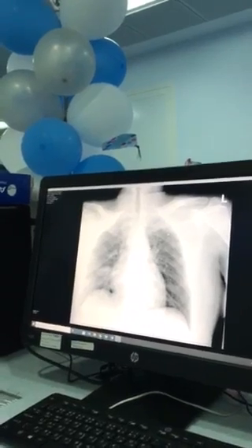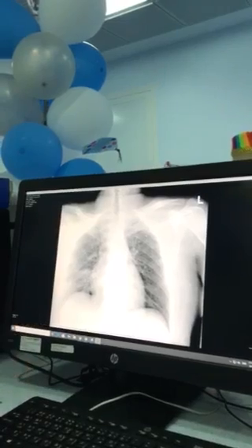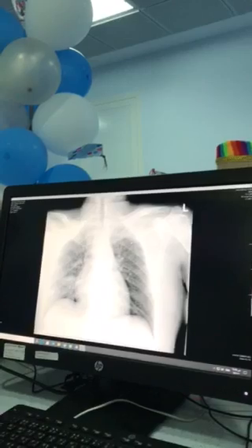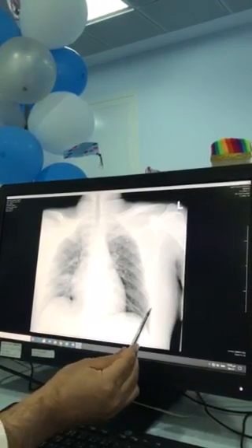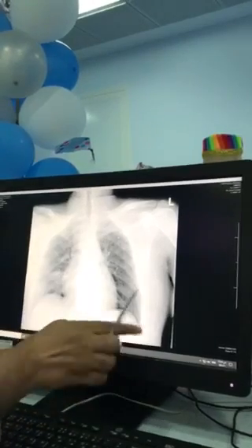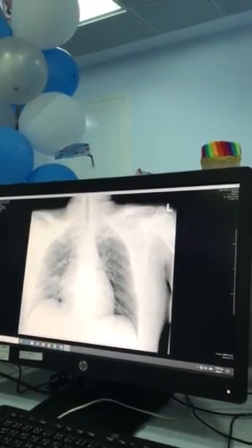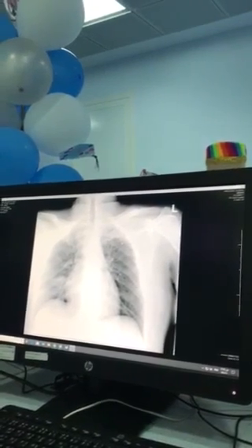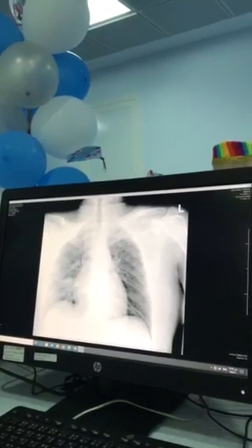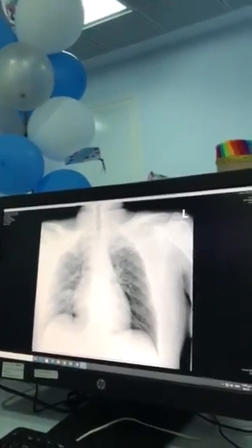This is fluid. If it is fluid, usually you will see it deep here in this angle. So black also? No, you will see it white because fluid is white. Okay, so if you see this area like this and you see only like this, there is no sharp angle. That means the fluid is accumulating here down. So this is pleural effusion. They say pleural effusion. Hemothorax. Hemothorax will be the same as pleural effusion usually. Yeah, the fluid, blood or fluid is always the same.